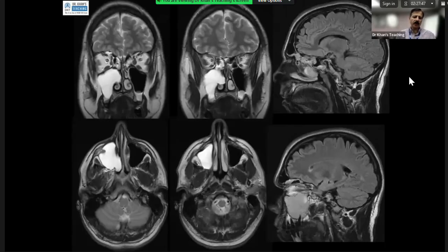Now, if you see here, the lesion is in the maxillary sinus. Here, it does not go into the ethmoid sinus. It is sitting in the nasal cavity. So this is the inferior turbinate, this is the inferior turbinate, and the lesion has gone here. So through which structure will it go here? It must have caused expansion of something, and that is why it has gone here. So we will go now into teaching mode regarding anatomy, and we will come back to this case.